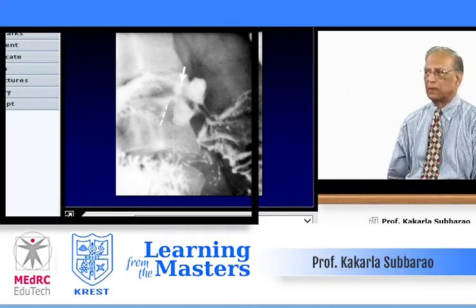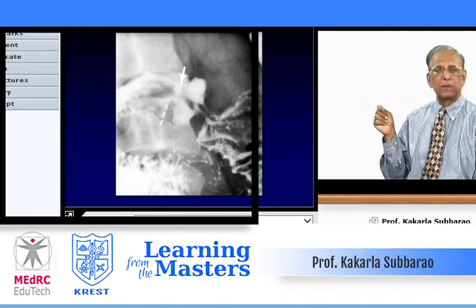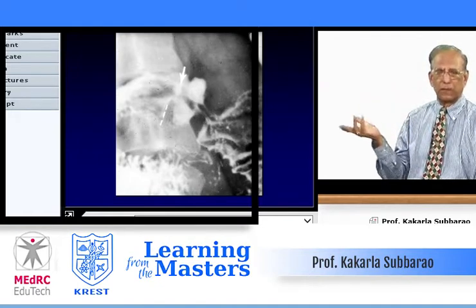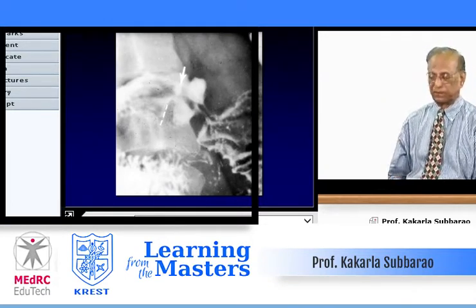Duodenal ulcer, acute duodenal ulcer, cause of hematemesis. Look at the pea-sized double density in the duodenal bulb. Not only give contrast barium, occasionally you can ask them to swallow, say, or drink a soda which contains a lot of gas, and you can get almost a double contrast study.